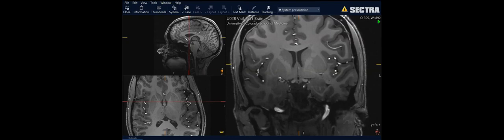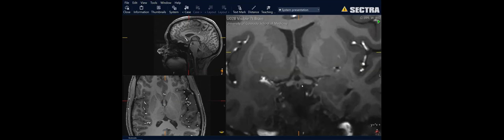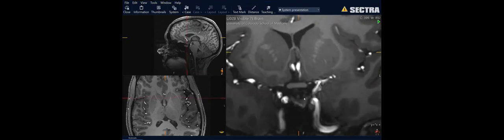So if we pull anteriorly, you can see how we've got this communication there. What we're actually looking at is the two anterior recesses of the third ventricle. So remember, there was a recess associated with the pituitary stalk or infundibulum and a supraoptic recess. So we've got optic chiasm, supraoptic recess, infundibular recess. So if we pull anteriorly, you can see that infundibulum give rise to the pituitary. Okay.